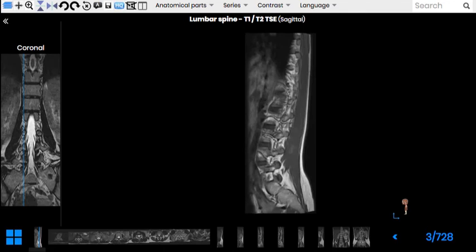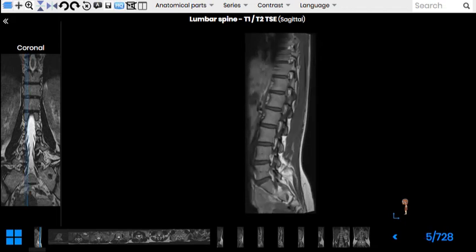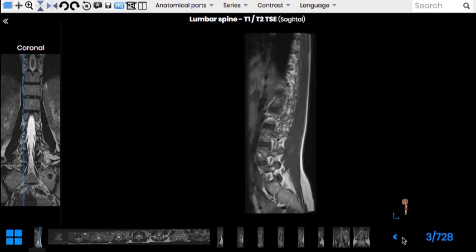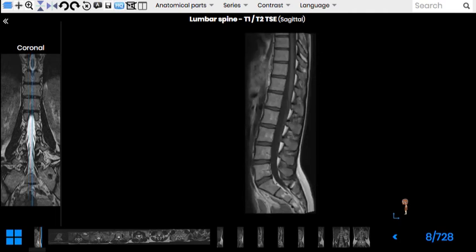Let's look at the MRI now, as it allows us to see all the structures much more clearly. The muscles behind, you see the beautiful erector spinae, the bodies of the vertebrae, the perfect foramina here, and the other intervertebral foramina with the contents. The contents are nerves, of course, and the beautiful IV discs, which are quite healthy. So I would say this belongs to a young person. And as I go further toward the midline, right here, I can see the beautiful vertebral canal with the spinal cord inside, and the ligamentum flavum behind, which is kind of whitish.